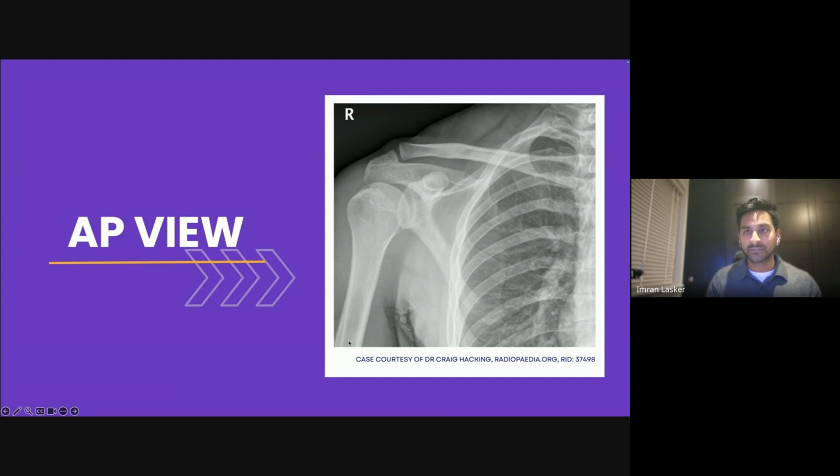Fractures are something that's introduced brand new to the person, and then they end up getting a big fracture, and then it looks very black with no kind of transition. It's just a black line in the middle of everything, really. And again, I'll show you as time goes on what that really looks like.